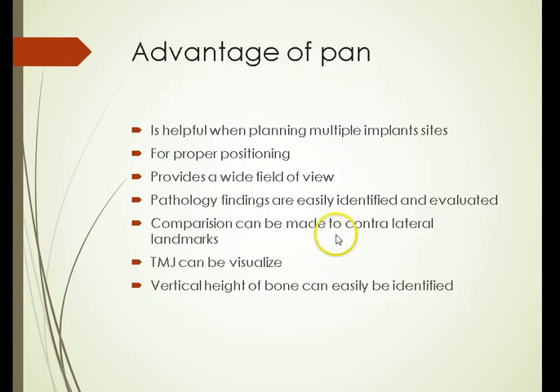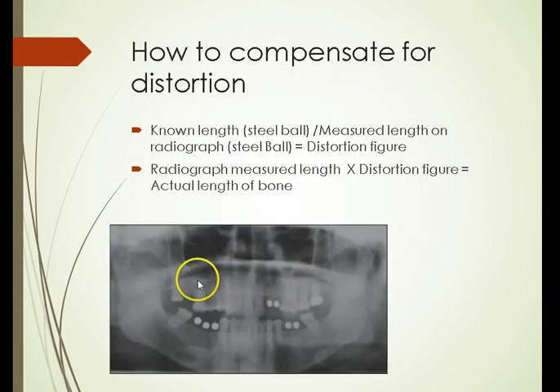Well, let's just do it right now. So, for example, this is the floor of the sinus. And when we take a CT, we'll look at this floor of the sinus and see it's not uniform like that. There's almost like a cup that goes in there. And this line really, we don't know what exactly it represents. Within that cup of the sinus itself, it could be the top part or the bottom part.